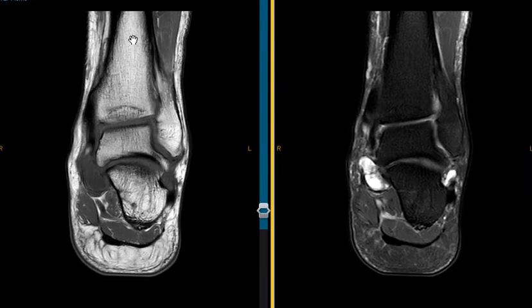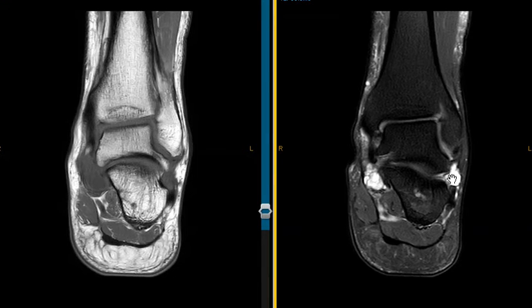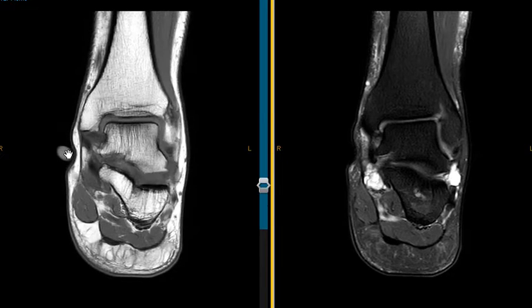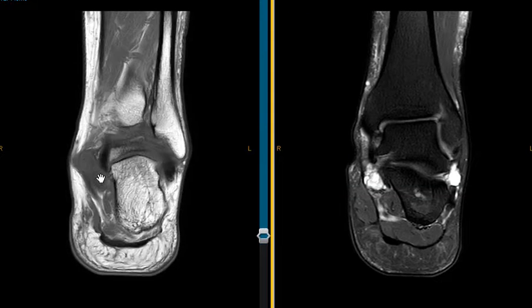Now in this one, there's no fat suppression. This is called a T1 view. So on T1 views, marrow is bright, subcutaneous fat is bright, and fluid and pathology are often dark. So this is dark on this one. You can see how different the T2 and T1 weighted images are. This area over here doesn't really show up very well in the T1 images, but it shows up pretty good here on these T2 weighted images. And over here we can see a marker which has been placed over the skin. It's indenting or tinting the skin here, and that indicates where he's feeling that palpable abnormality. And sure enough, it's right there over this area that's abnormal.